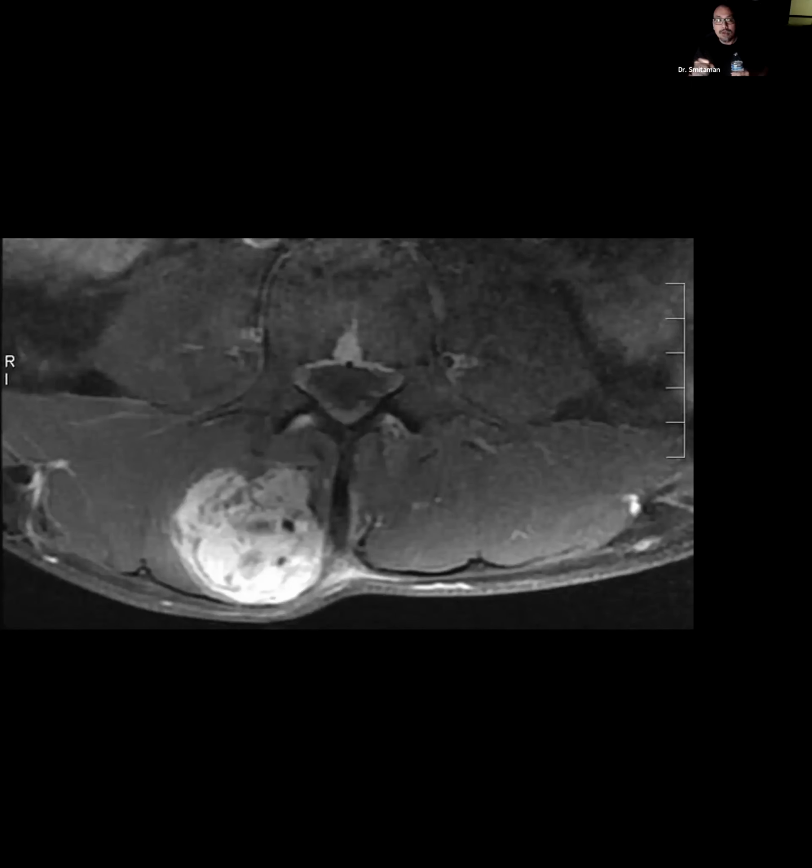When they do occur, I want you to think of lung cancer, melanoma, and other primary malignancies involving the GI and GU system, such as renal cell carcinoma. Those are the ones that love to involve muscle with mets, as in this case, involving the right erector spinae muscle. I think this was an RCC, and you can see here it's quite hypervascular with a couple of flow voids in here supporting the diagnosis of an RCC.